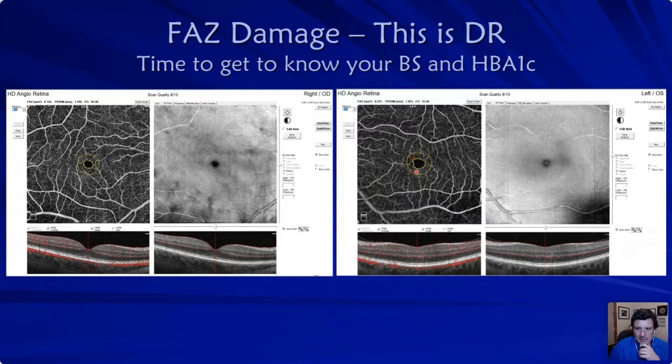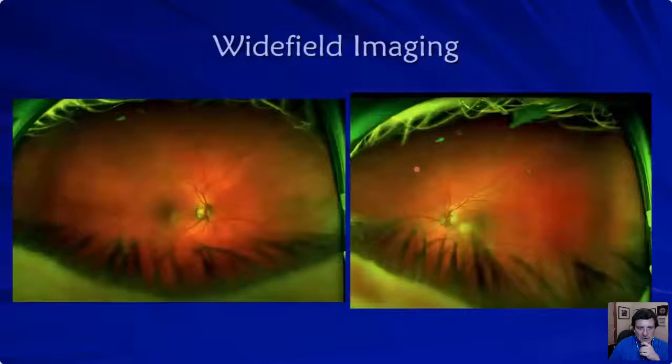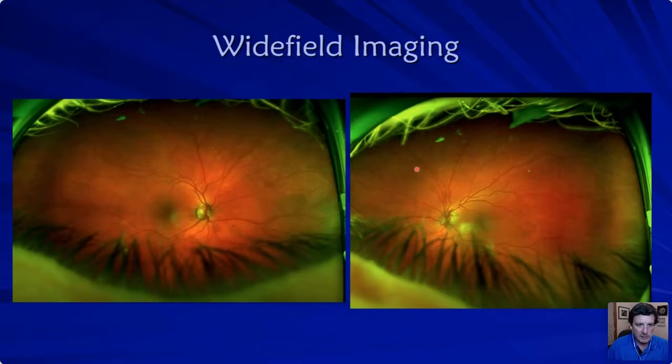But take a look what's happening to this eye. We're picking up on diabetic retinopathy at a very early stage. In the old days, there are no dot and blot hemorrhages, no exudate, no IRMA, no neovascularization of the disc or elsewhere. Those are all kind of macro changes. We would probably send to the retinologist or to the primary care and endocrinologist.